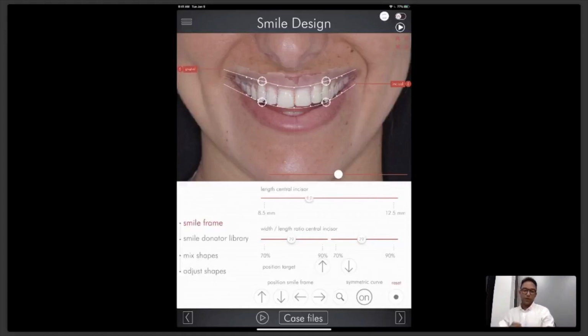So this patient, for example, I'm going to do in America. I'm going to go from tooth number 7 to tooth number 10, and outside of America, I'm going from tooth 22 going all the way to tooth number 12.